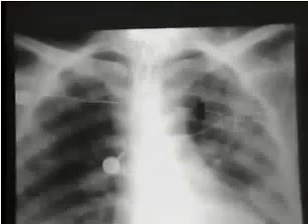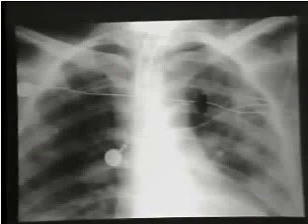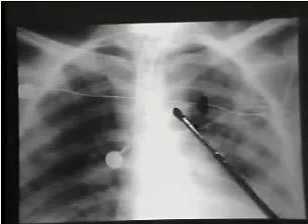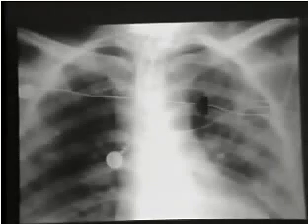As I mentioned before with left superior vena cavas, sometimes catheters may reveal some of these anatomic structures for us. If you look very closely here, you'll see that this catheter, which was put in from the left subclavian, followed the brachiocephalic vein, but instead of crossing the mediastinum, as it should, it curves around and out around the aortic arch and then down again into the hemiazygous system. This vein has entered the superior intercostal vein and then gone on around the aortic arch. That's a fairly unusual place to put a central venous line.